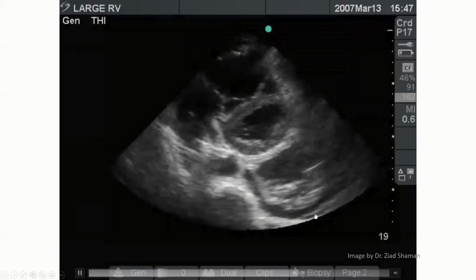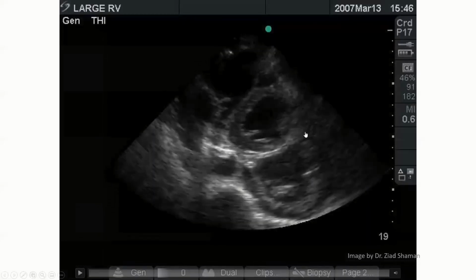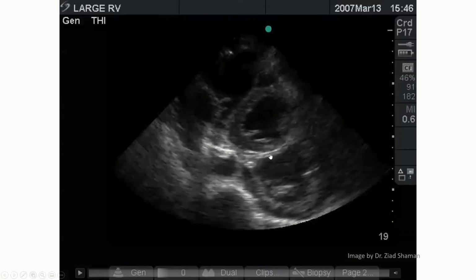This is actually a combination of artifacts. This is a kind of mirroring, and the pericardium causes this mirroring. On the other hand, it is also an artifact related to velocity errors, which is why the image is distorted.